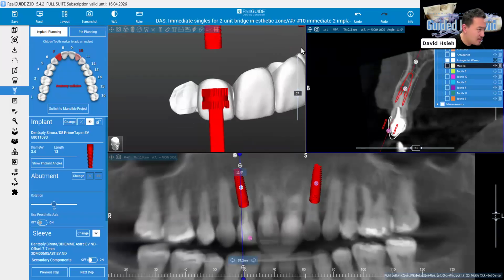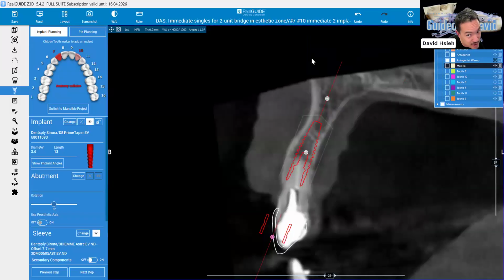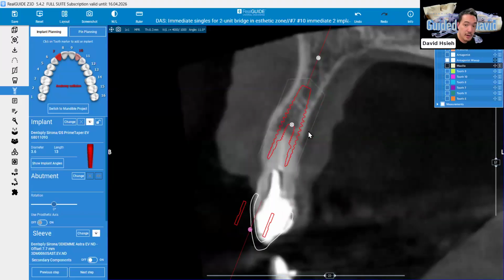So is that an issue? Yes. Can we fix that? Also, yes, right? Knowing now the abutment, like dynamic abutment solution, you have the chance to use an angled abutment.